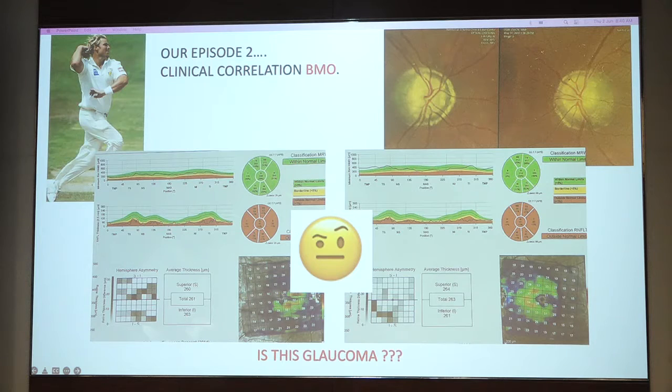Now, what is remaining is the drusen. The nerve fibers have gone. So the machine is measuring the drusen. Yeah. BMO. Yeah, you can. So, but for the person who cannot see the BMO MRW, that's the whole point, right? You don't have the image of the BMO MRW. If you don't have this OCT and you don't have those 12 scans, then you are straight away bamboozled here, like Warne used to do.